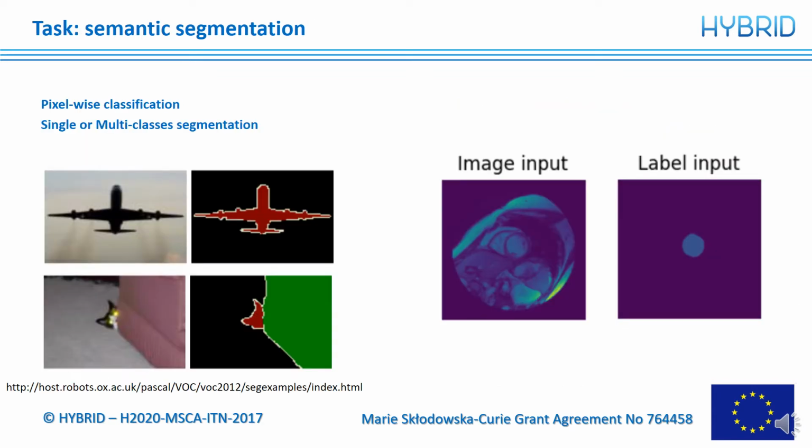Moving forward to the main part of the video, in deep learning terminology, we are going to work with the semantic segmentation task. That is a pixel-wise classification where the output of our model is an image with exactly the same size as the input, but with, in each pixel, a classification of the object of interest.